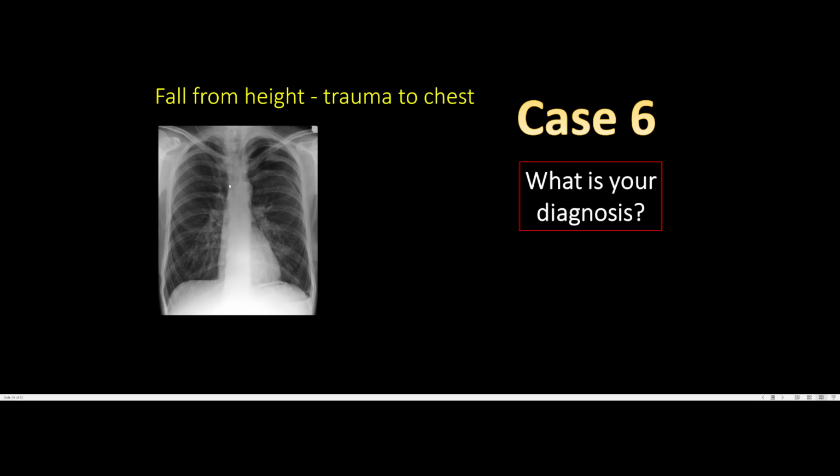All right, so this is a PA chest X-ray. Again, the lung fields are clear. The heart size is normal. If we look at the left hemidiaphragm, they're normal. The costophrenic angle, they're normal. If we look at the right lung field, we can see that overall they look normal. The ribs, there's no subcutaneous emphysema, for example. There's no broken ribs that we can see here. The mediastinum relatively is fine. The hilum, there's no lymphadenopathy. Again, you make your search.